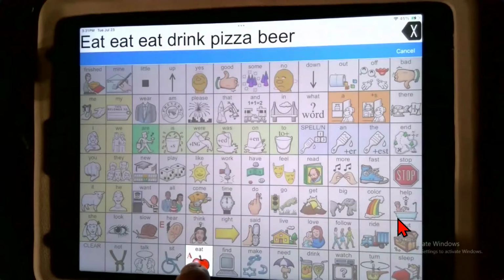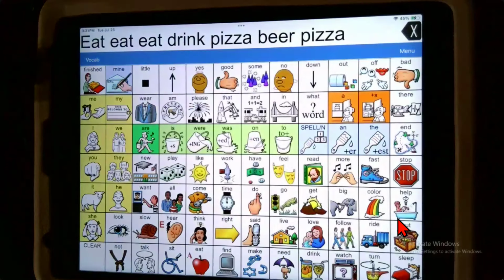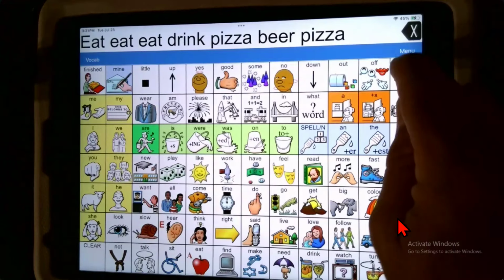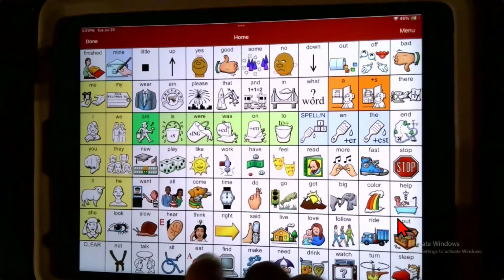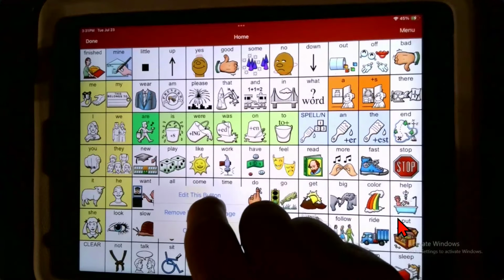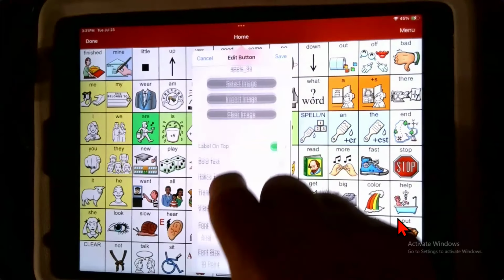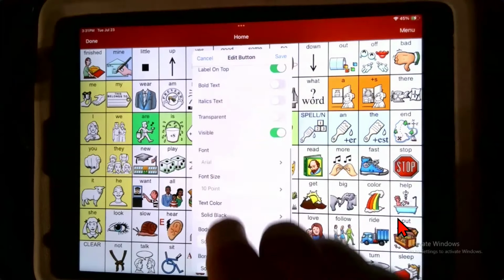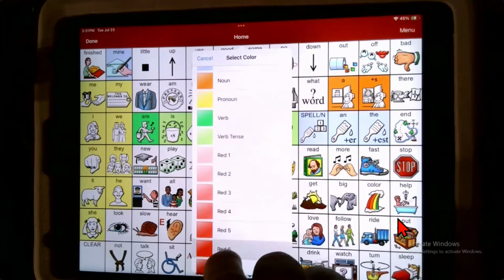Now, if this works, great. Then you can try it a few more times. If that does work, then I got one more little thing I want you to think about doing. What if this button, the sequence you've been working on, what if you said to that button, edit this button, and you said, I want that one button just for a few hits. What if you told the body color to be red? So instead of body color white, you said red 6.